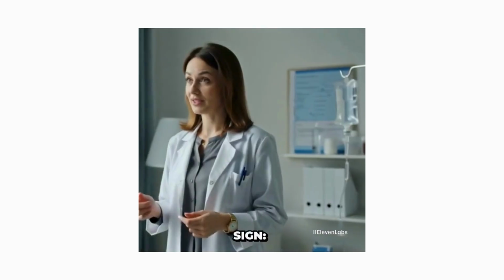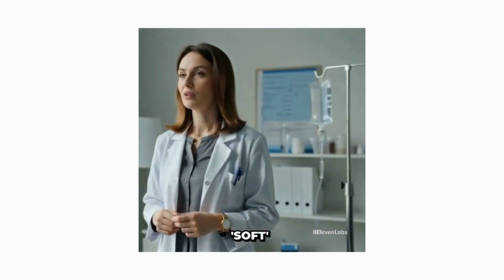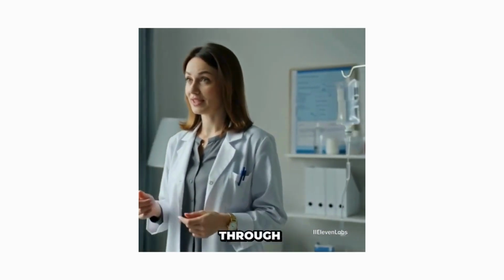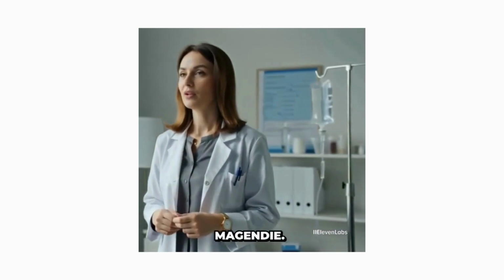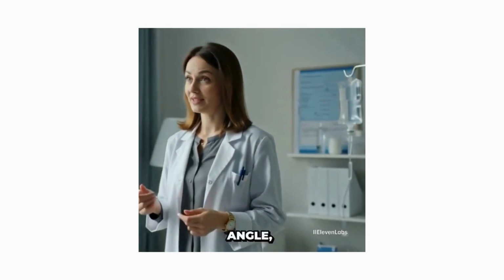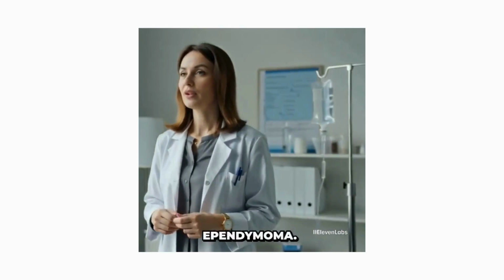The plastic sign. Ependymomas are soft tumors. They don't just grow, they mold and squeeze through the foramina of Luschka and Magendie. If you see tumor extending into the cerebellopontine angle, it's almost certainly an ependymoma.